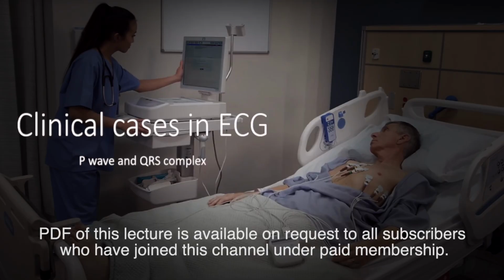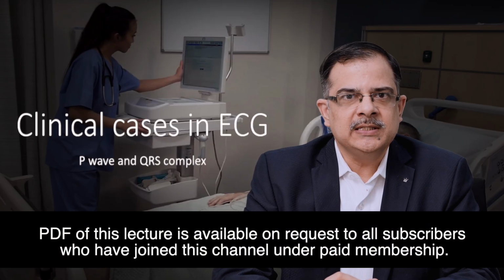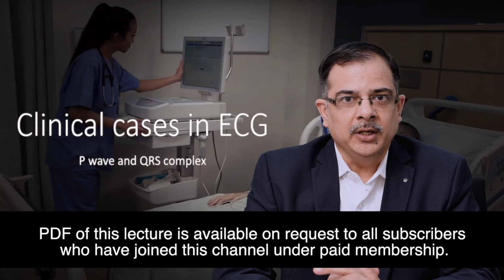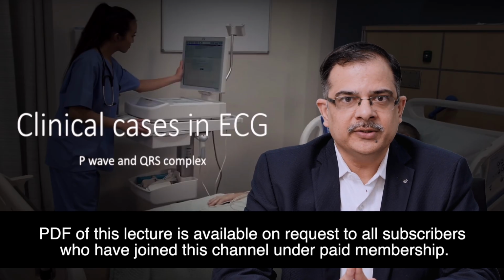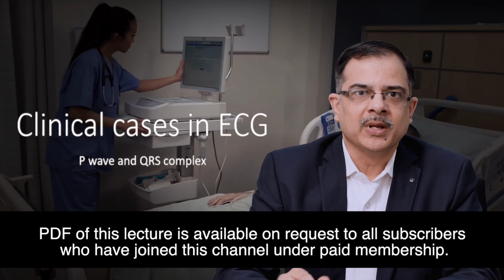Hello everyone. In this video, we will discuss clinical cases in ECG and we will be covering P-wave abnormalities and QRS complex. So this video is mainly about how to go for analysis of the ECG. We should go for clinical information first. We should make our differential diagnosis, then look at the ECG.